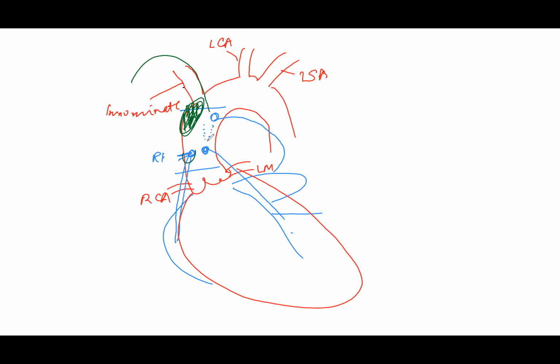This is easier, this is easier, and then this is easier. From the left side, it's much easier. You see, you can have a catheter down here. This becomes a little bit more difficult, but you can get these grafts very easily down here and down here. Femoral is also easier because you can get this. So make sure if there's a graft here, you should know about it. And you do use different types of catheters for that. Any questions about this?